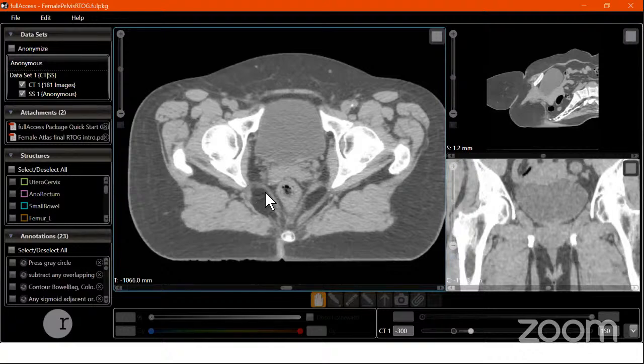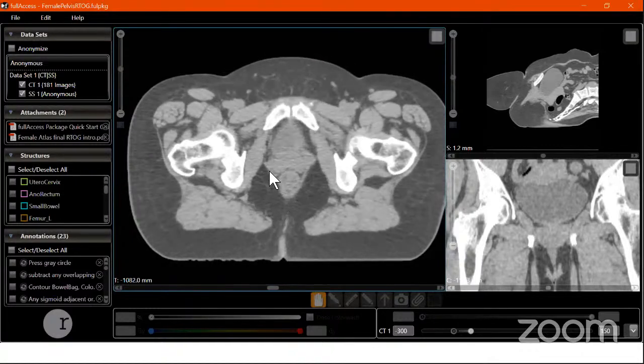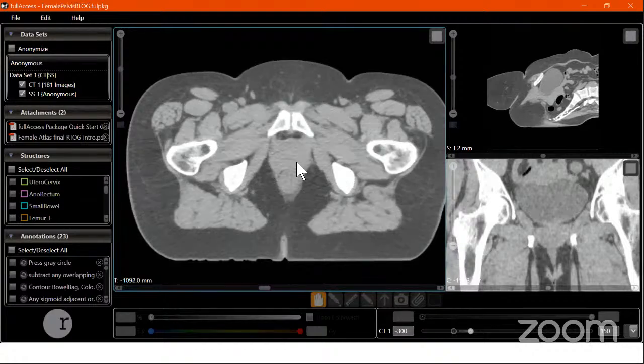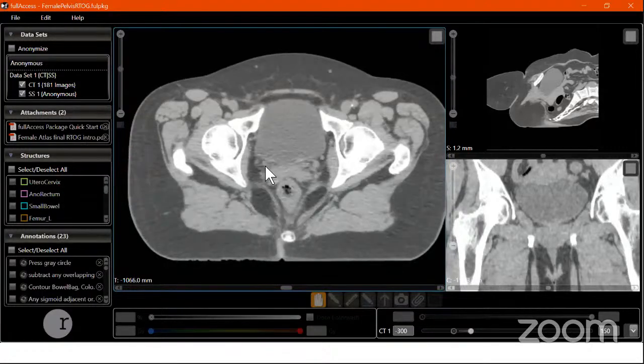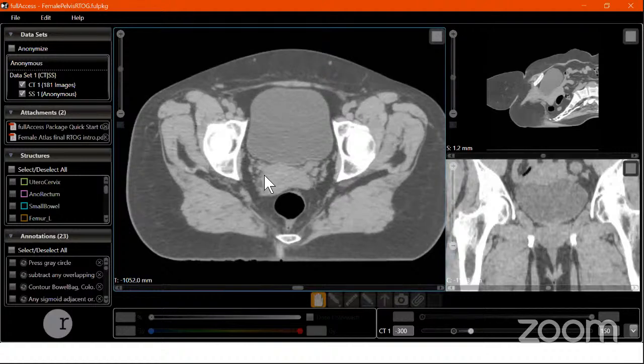Obviously, as you can see, the levator ani forms a lateral part as well as the inferior part of our pelvic cavity. The levator ani, as I said, comes and fuses onto the perineal body in front of the rectum over here. So all the white spaces that we see are practically either a paravaginal space or a parametrial space, depending on the slice we are looking at.